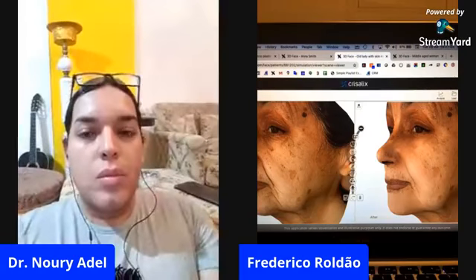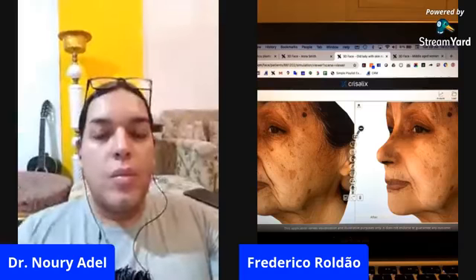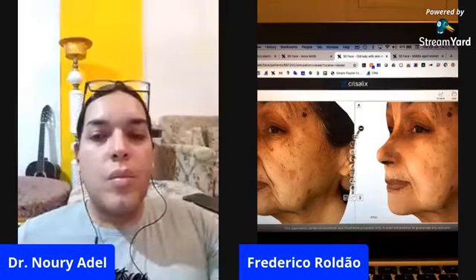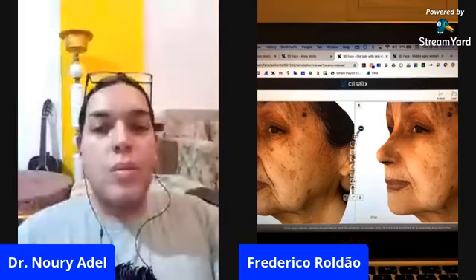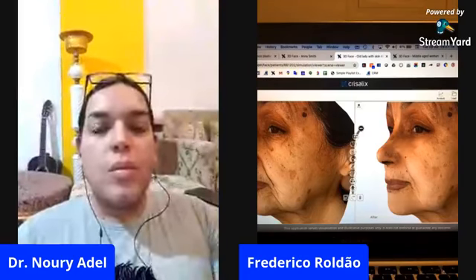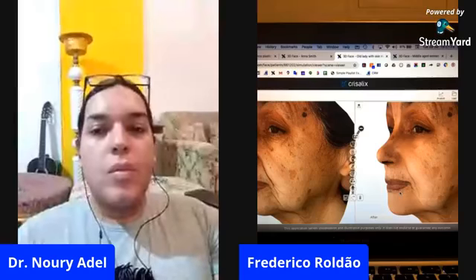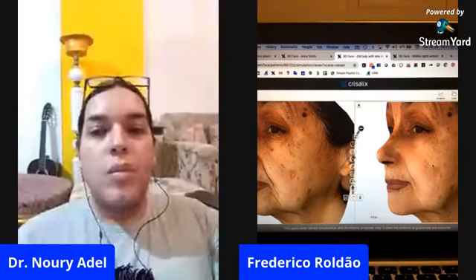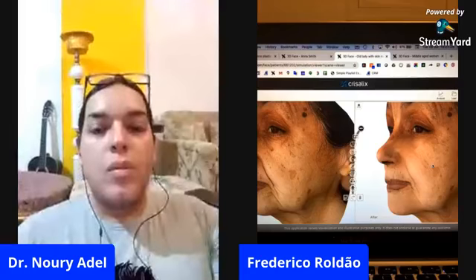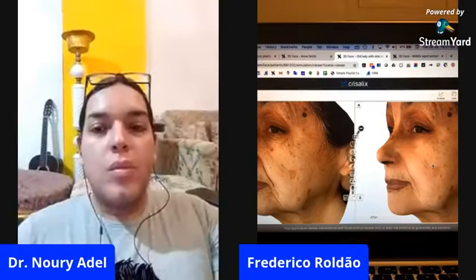looking just like I did a few weeks ago. And you can just create another 3D and compare it with the previous 3D and show her, look, here is a difference. Your nasolabial fold is different, or your lips look different, or your jawline is different, or your tear trough, whatever, you know? So it's very good for record keeping so that you have your patient's history.